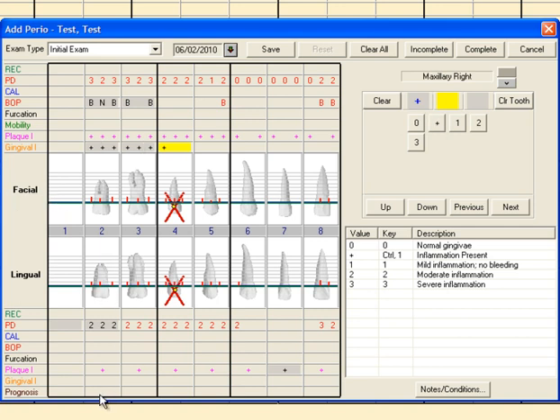However, as we go to the lingual, it will only allow us for plaque or gingival index to record a midlingual site. You'll see we're only able to go to the midlingual aspect. Gingival index, plaque index, 4 sites per tooth, 3 on the facial, 1 on the palate. Probing depth, 6 sites per tooth. Bleeding on probing corresponds to the 6 sites on every tooth that could potentially bleed upon probing.